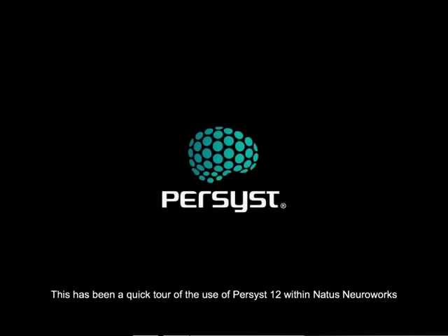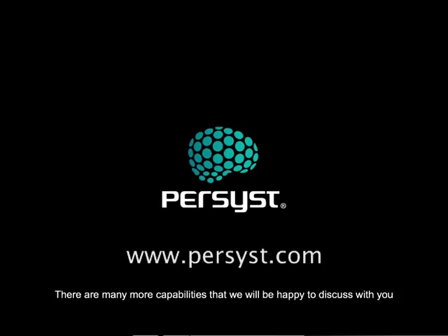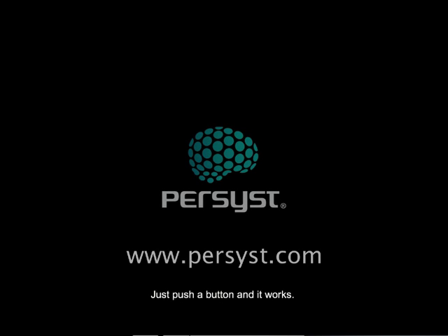during monitoring. This has been a quick tour of the use of Persyst 12 within Natus Neuroworks. There are many more capabilities that we will be happy to discuss with you. All of the trending, detection, and artifact reduction you have seen is completely automatic. There are no patient-specific settings required. Just push a button and it works.